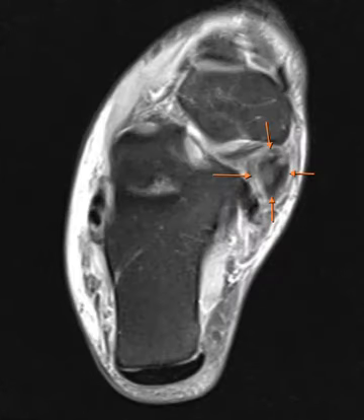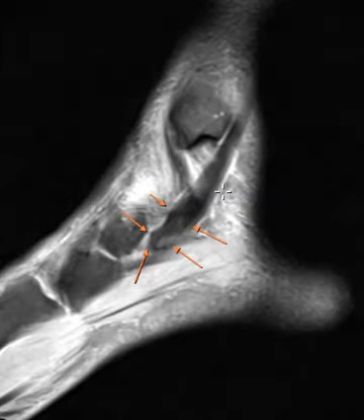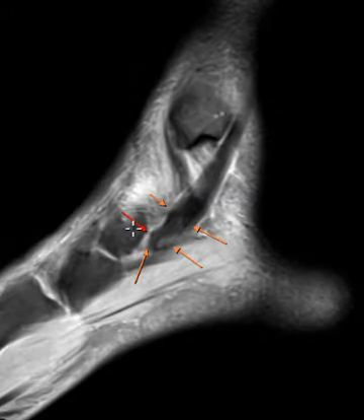If we look on the sagittal images, we can see this as well to confirm, because it can be difficult sometimes. Here's the medial side, and this is the image that shows it. So right here we see the navicular bone, we see the posterior tibial tendon, and normally it'll angle more towards the navicular. It looks like this angle is a little bit more posterior than we'd expect. Again, we just never see it touch. There's a little separation here. So partially torn, partially stripped from the navicular attachment posterior tibial tendon.